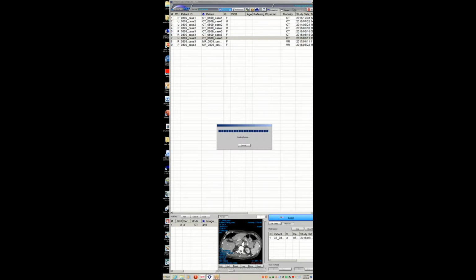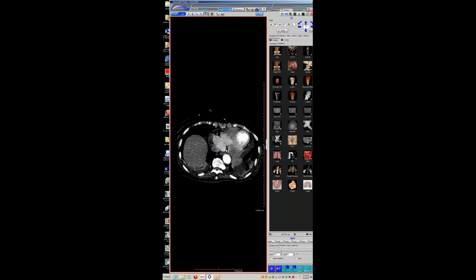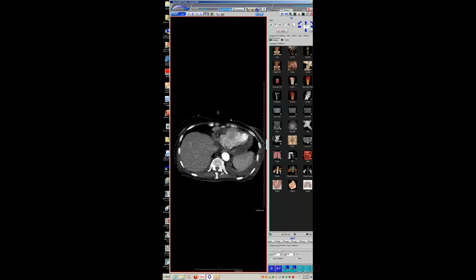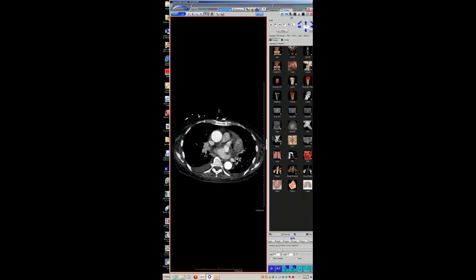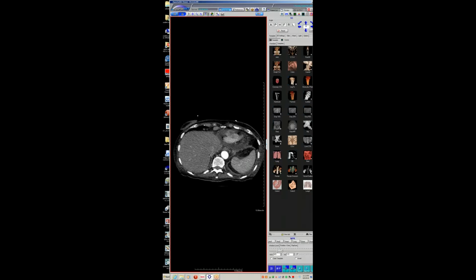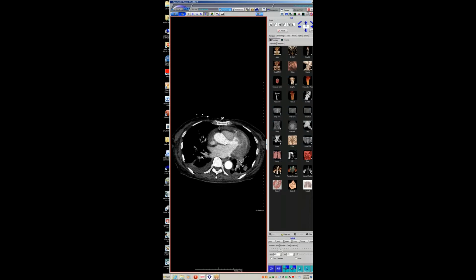You could think of other metastases, but really this is infiltrative. And so this is literally a few months later, maybe 2 months later. And now you can see multiple infiltrative cardiac masses. This one's actually popping through into the pericardium. You're seeing nodes everywhere, and these pulmonary nodules have grown. And this was actually B-cell lymphoma. So it's a nice case.